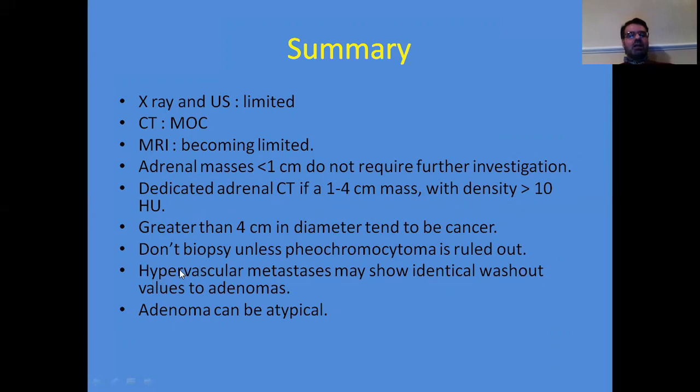And be aware that hypervascular metastasis may sometimes show washout values identical to adenomas. And also be aware of the atypical features of adenoma.